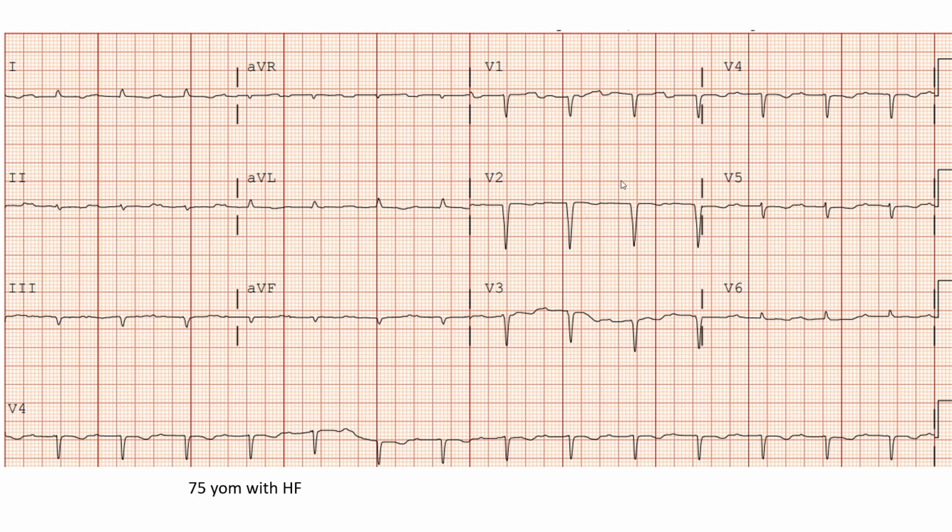When you see that EKG, one diagnosis should pop in your head. Yes, it could be MI, but there is something else. I'll tell you, okay, you think it's MI. Well, his echo shows normal EF and no segmental wall motion abnormality. Now, what's the diagnosis? Amyloidosis, yes. So let me summarize it here.